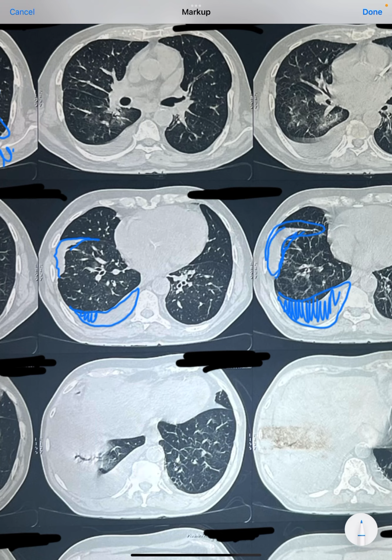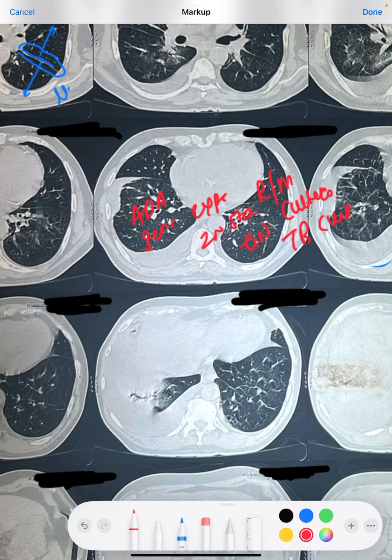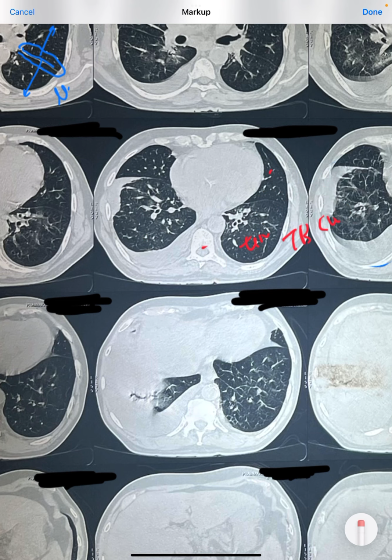Such patients should definitely undergo USG guided drainage of such pleural effusion, and it should be sent for ADA. It should be sent for GeneXpert. It should be sent for ZN stain. It should be definitely sent for gram staining. It must always be sent for routine and microscopy, culture and sensitivity. And if the patient's condition looks bad, or if you suspect resistance to an anti-tubercular medicine, then we should definitely send it for TB culture and sensitivity, because it takes more than 4 weeks for the report to come. So such fluid should always be sent for TB evaluation.